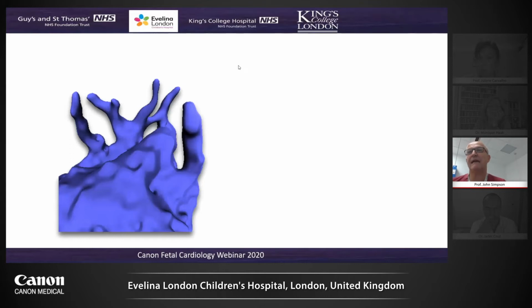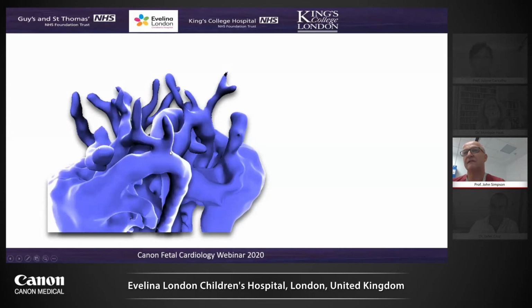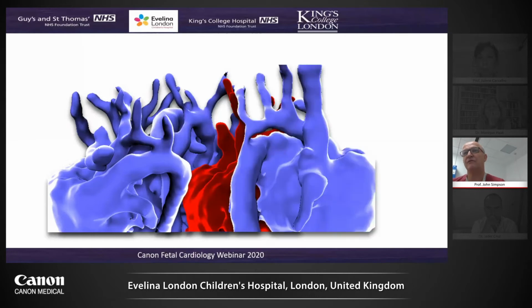Some of the things we're looking at, and I'll show a few more pictures later on, are now with our motion-corrected fetal cardiac MRI, we can get really novel insights into the anatomy of the aortic arch. These are fetal cases, and this is looking from the back, looking at the size of the distal transverse arch and the ductal arch. And we're looking at this extensively to see if this can actually give us some better predictors of postnatal coarctation. You note here the end-to-side anatomy of the transverse aortic arch. And there's really a multitude of examples here, and I'll stop there. Otherwise, we'll just look at coarctations all evening.